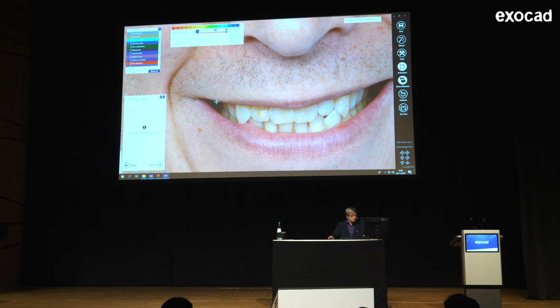Now I have to draw a lip line around the mouth. And at that moment, I would actually like to thank Paul for his beautiful smile for this case, because he does not have the normalest of lip lines, to be honest. And I don't mean that in a rude way, because it's really fun to work on a case that's not the complete standard case, where you really see why you need smile design for some cases. In a completely normal generic case for demonstrations, you wouldn't even need smile design because you can just place the teeth perfectly by hand.